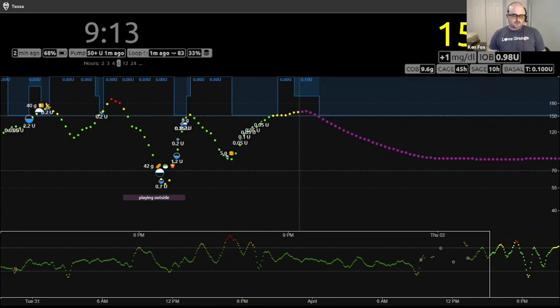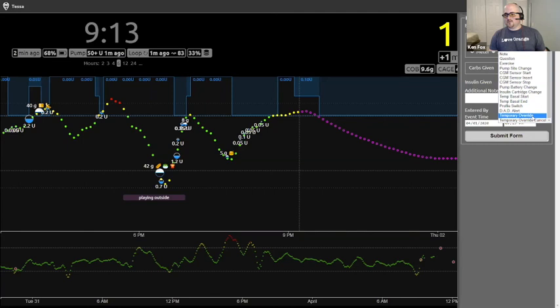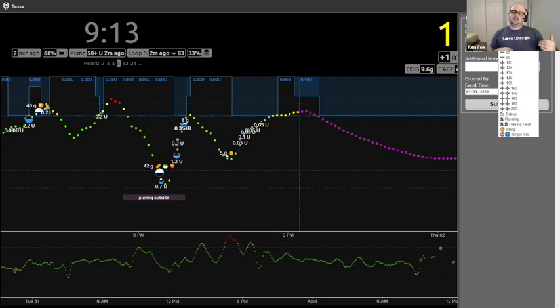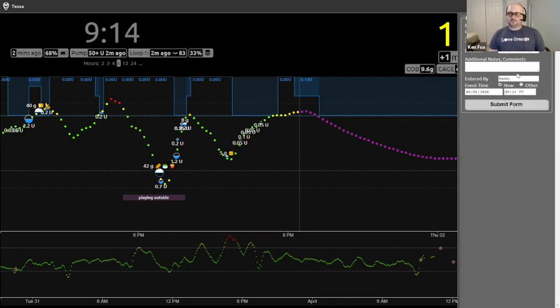Okay, so care portal we've covered: must be authenticated, notes, exercise, pump site change. So temporary overrides, this is for remote overrides. You can set a temporary override, and what happens is once you've gone through the process of setting all this up, which I won't cover here, all your preset overrides sync up into Nightscout, and you can pick one to use. But a fun tip you don't always know about is you can pick an override, and then you can actually tell it how long you want it to run.